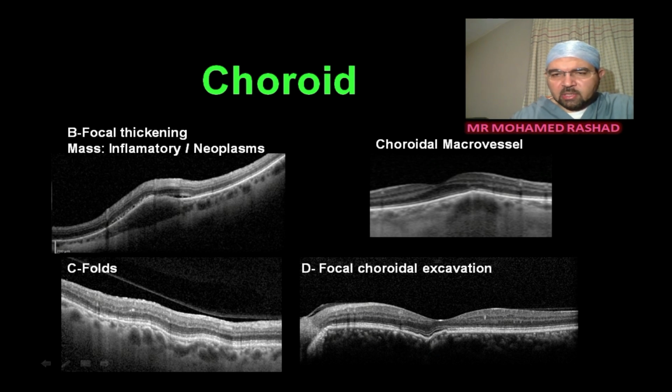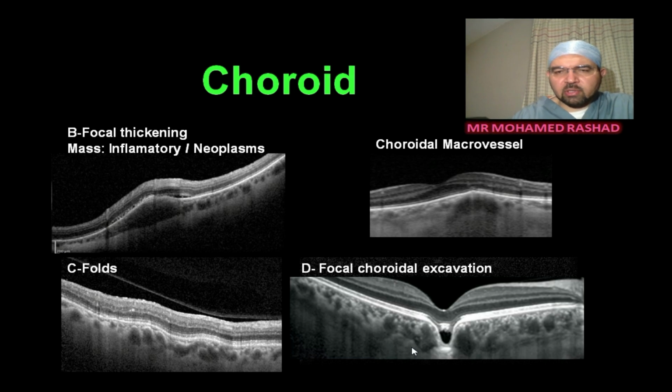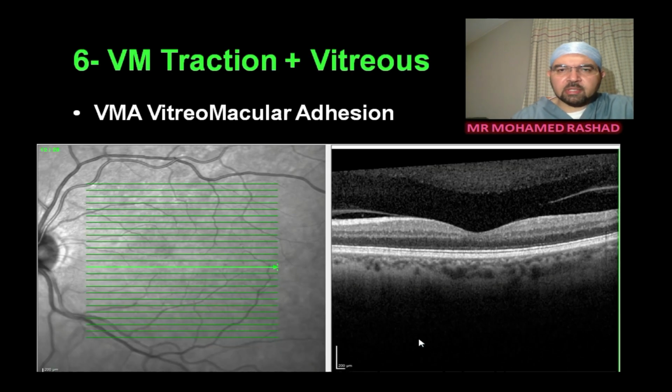If we find that the photoreceptor layer is lining this choroidal thinned part, or the choroidal excavation, we say that this type is conforming. If we find that the photoreceptors are not lining this kind of thinned choroid, this is the non-conforming type. And the theories about this are that it might be an ischemic area that happened, or choroidal insufficiency.